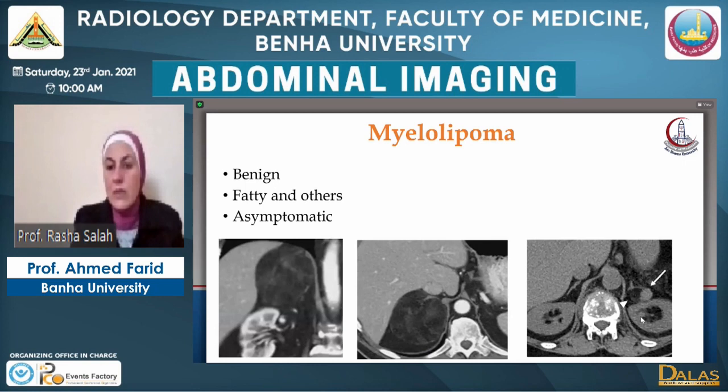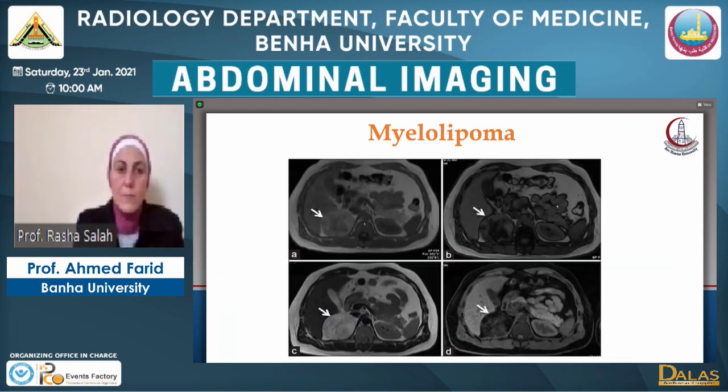Another example of myelolipoma, which has a mixture of fat and soft tissue component like this, and if we see just this fatty component, then we are dealing confidently with a myelolipoma.